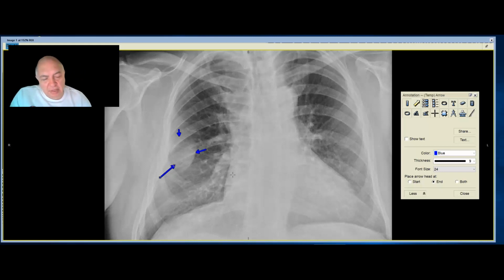It could be a benign lesion such as a hamartoma, or it could be a lesion in the ribs, or even in the lungs themselves, or something on the chest, maybe in the breast tissue or the wall of the thorax.